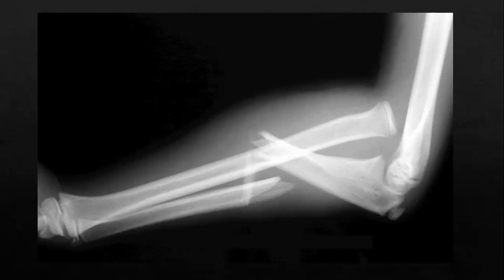There also seems to be a dislocation of the radial head in the dorsal, no, it's dislocated and it's okay. Other than that, there seems to be soft tissue swelling and nothing else to note. The bone itself, within the cortex and the medulla, looks to be good quality bone.